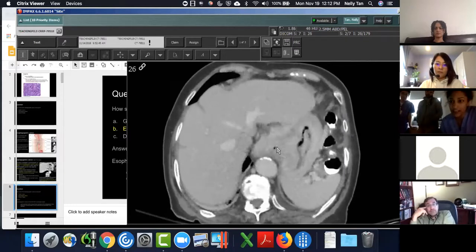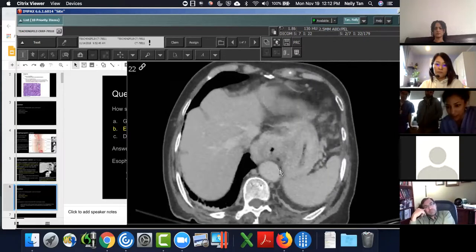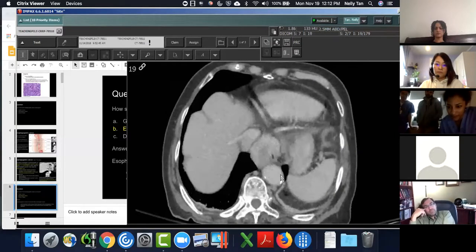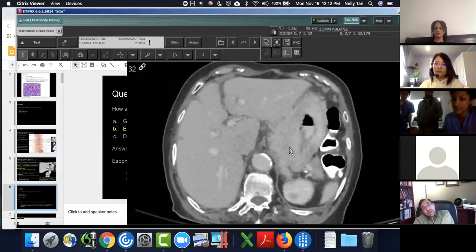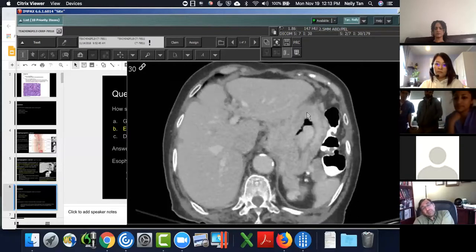Yeah. And then if you scroll down a little bit, yep, see right there, you've got that thick enhancing part. That's all mucosal tumor. On the greater curvature, you've got a centimeter's worth of enhancement that's very abnormal. And the case that I'm describing, it was just gastritis. It didn't have that thick layer of enhancement. It really just had a lot of edema in the wall and not as enhanced a layer on the surface.